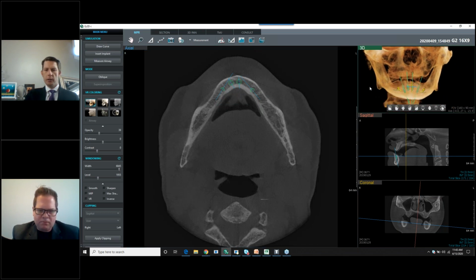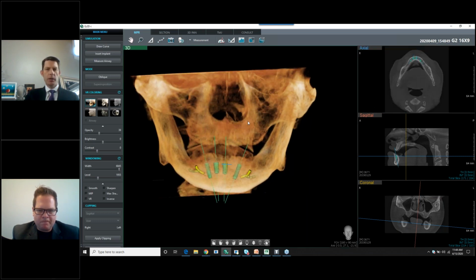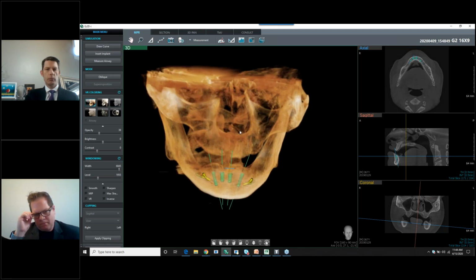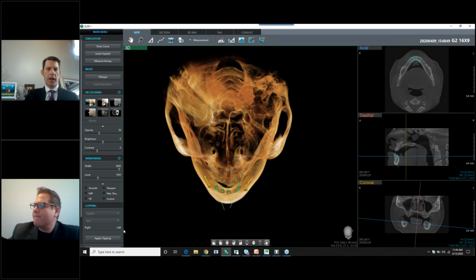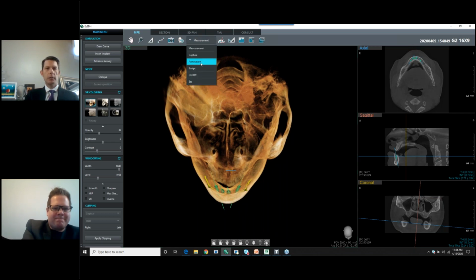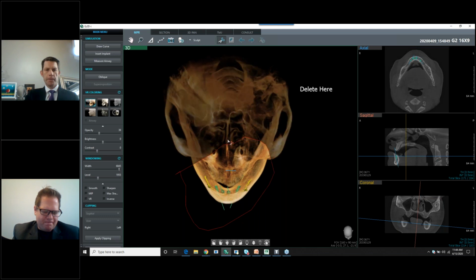But we can do a right click here, switch to main view, and we can see our case plan. So if I did want to show the patient this, we could scroll here. I could use my annotation and my sculpt tool. Let's cut everything out except for our anterior portion here. Let's delete here, and that's going to delete that off of there.